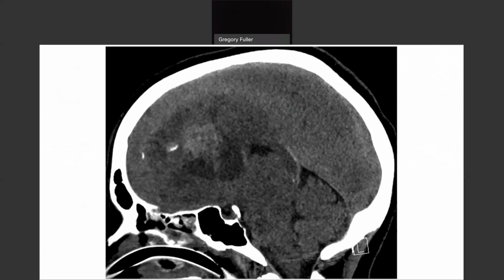If we were in the conference, with the old conference on Thursday morning, and you got the answer correct, I would say, yes, you're correct. Why? Anyone want to chat? I'm not seeing any chats popping up. All right, Andrew Gilbert, gyriform calcification. That is exactly correct. This was the key. Gyriform calcification. Yes, Dr. Harb, oligodendroglioma in the context of a lobar hemorrhage with gyriform calcification.